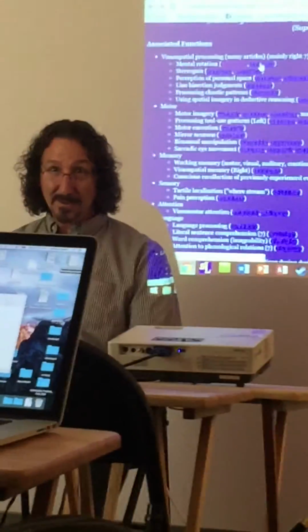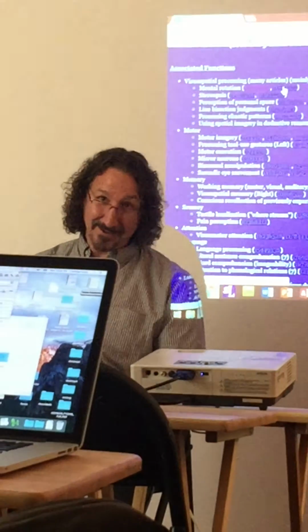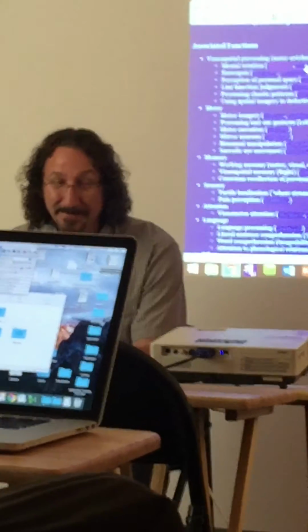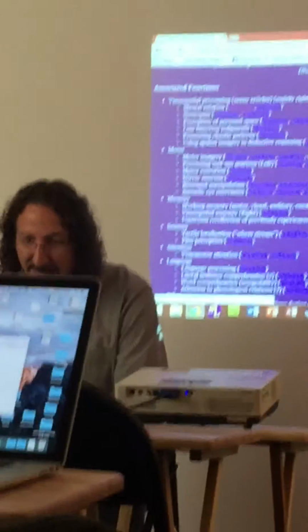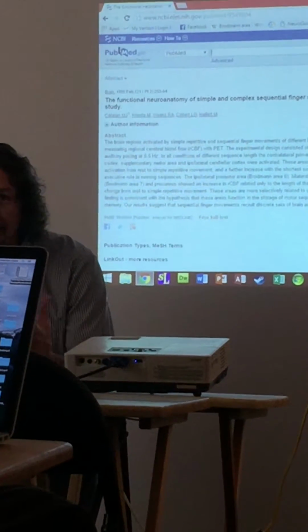I'm sorry, go ahead. I was going to ask who put it together. It's kind of amazing. FMRI Consulting, whoever they are. Just a private consulting firm. Guess so. It's brilliant. I love it. So, visual spatial working memory, I click on that. There you go. And so then you get more information.